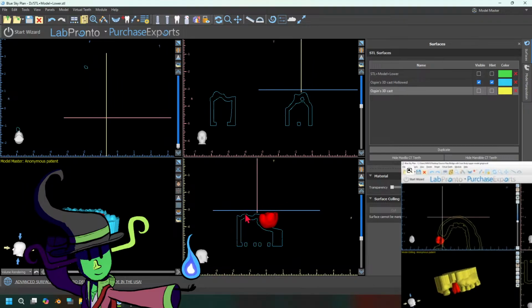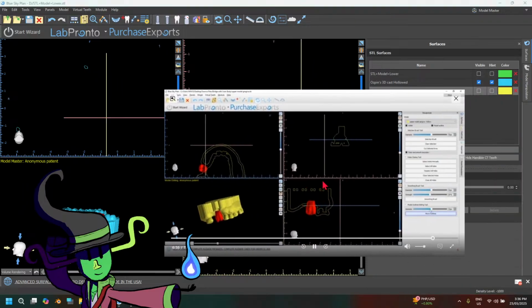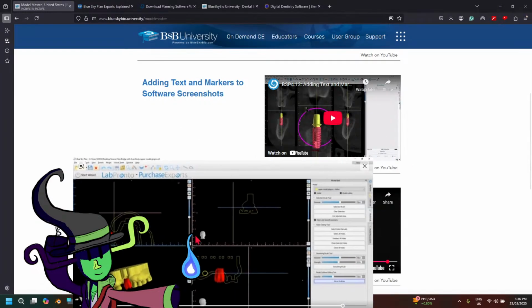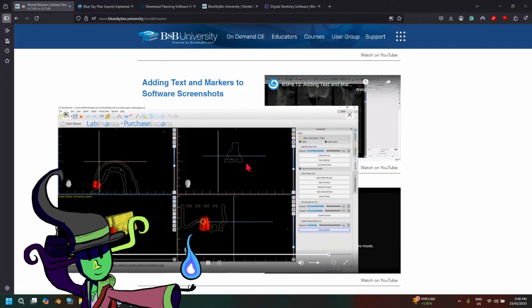Just realizing that it's really off-centered. By the way, it's gonna tell me how to name stuff here. Oh, it's in the other video. Never mind. And we simply grab and drag and watch in 3D as we do this. The outline, and we can see that our model updates.